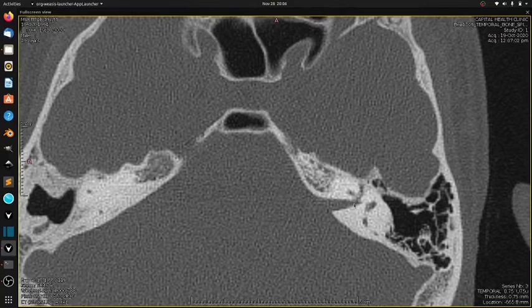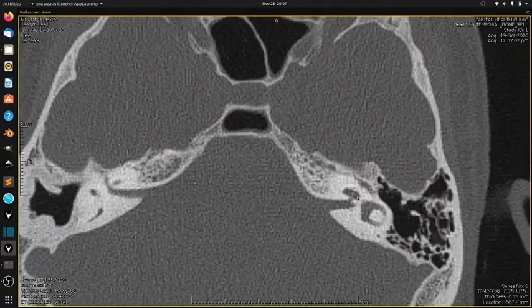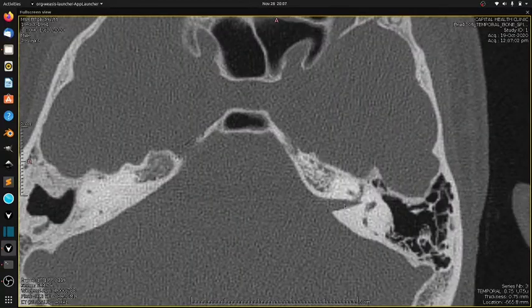Now the facial nerve and the vestibulocochlear nerve travel through the internal auditory canal, and it gives one branch to the vestibule, one branch to the cochlear side. Basically I didn't mention the cochlea here. I'll tell you where the cochlea is. This is the cochlea. So one branch will be going to the cochlea, one branch will be going to the vestibule. And now the question is, where is the facial nerve?